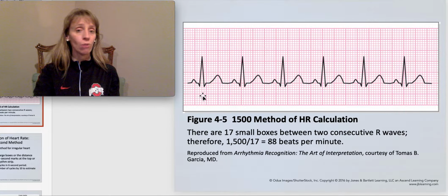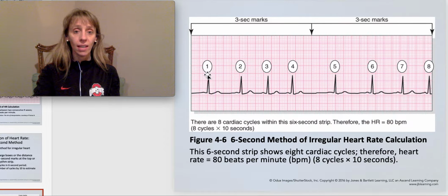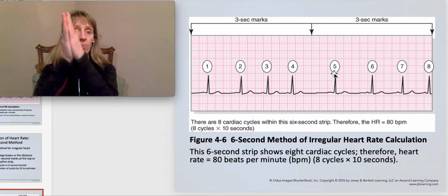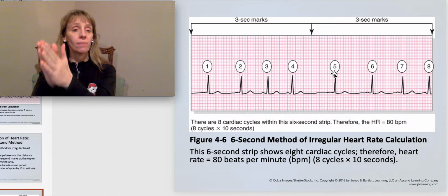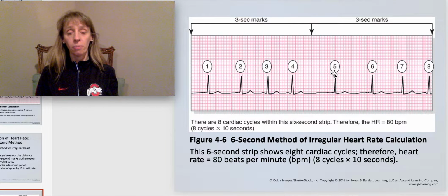In this rhythm, without knowing anything about the waves, you notice these R waves, right? The spike is the R wave, and it is nice and regular looking. We fast forward to this EKG, and we notice that the R wave is very irregular. It's not happening like a metronome. It's not happening in a cadence fashion. This is the irregular rhythm. This is an example of atrial fibrillation.